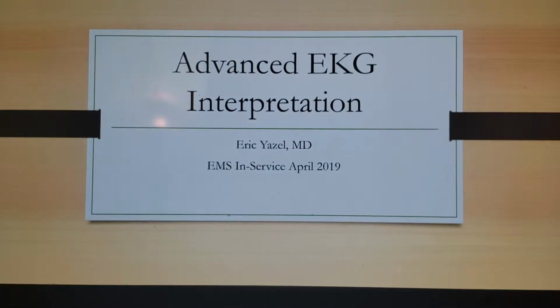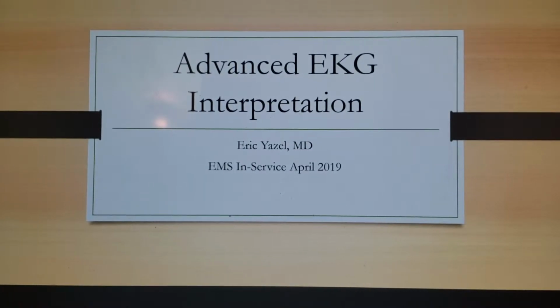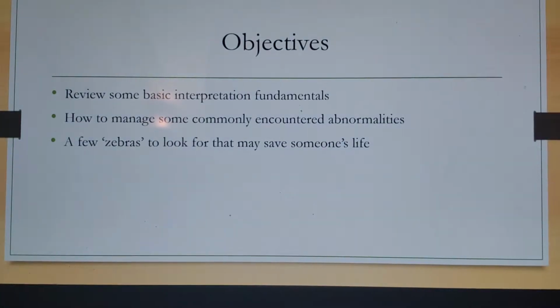I wanted to talk to you about some advanced EKG interpretation. We'll go through some basics and try to look at a few of the more rarely encountered 12 leads as well, and kind of go from there. So some of our objectives: review some basic interpretation fundamentals, how to manage some commonly encountered abnormalities, and a few zebras that may save someone's life someday.